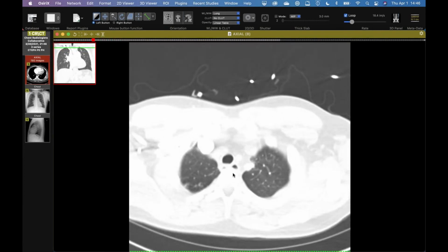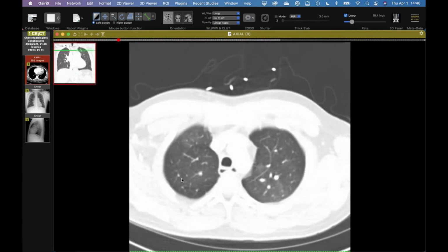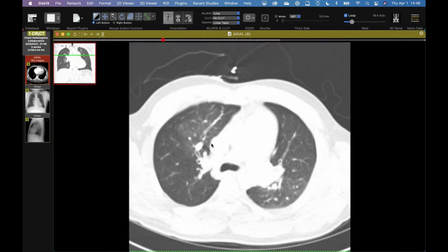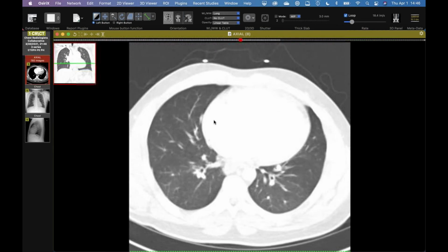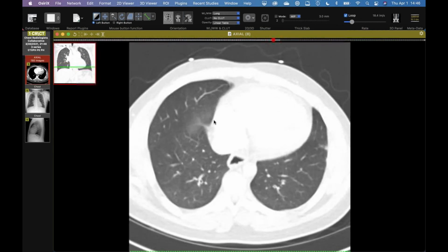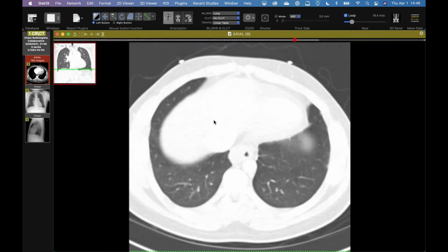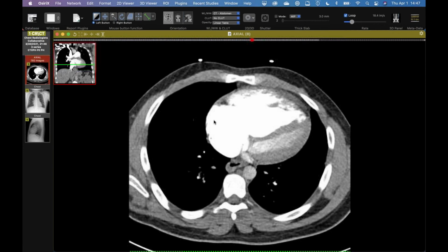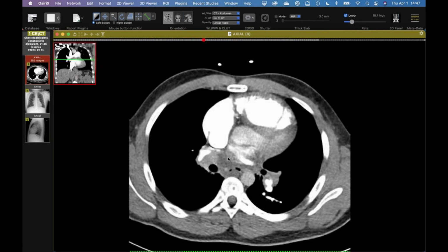And he probably has another one up here. At least he has some transpleural collaterals. If we follow some of these vessels, you can see they're quite tortuous, and some of them do extend towards the pleural surface a little bit. His pulmonary arterial pressures are about 100 millimeters of mercury, very, very high. And you can imagine this is not a good situation to be in with this underfilling of the left ventricle by compression and just very little return here.